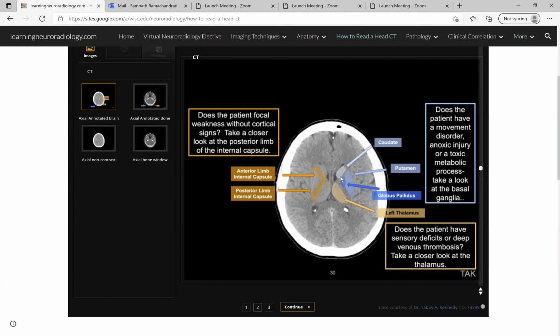And here you can see a good view of the basal ganglia. The globus pallidus and the putamen are both part of the basal ganglia. And then here's part of the caudate nucleus, which you see anterior. And this wraps around here. This is just the head of the caudate, but it's hard to see the rest of the caudate because they're really small structures.